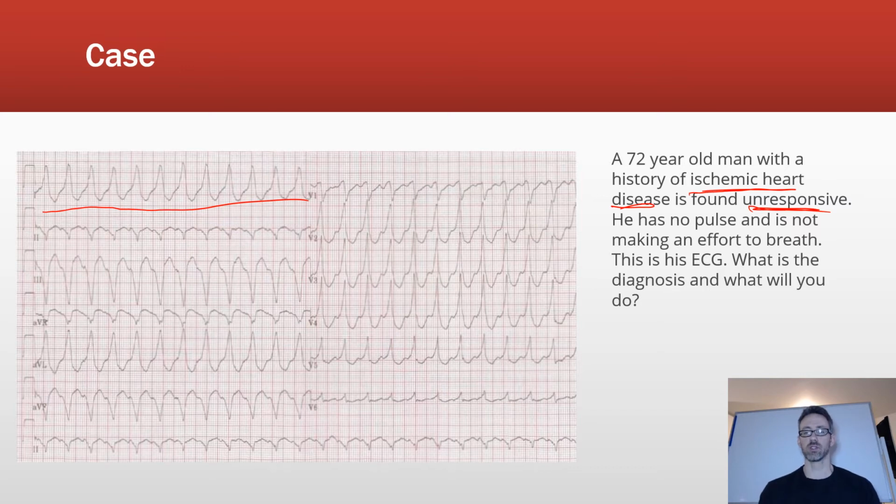responding. And we'll talk about what to do in the cardiology class actually. But in this case, this is somebody who we have to treat immediately. We have to recognize that this is VTach and not VFib. VFib would just kind of look like the baselines are all over the place with no clear patterns at all, not very regular. This does look regular.